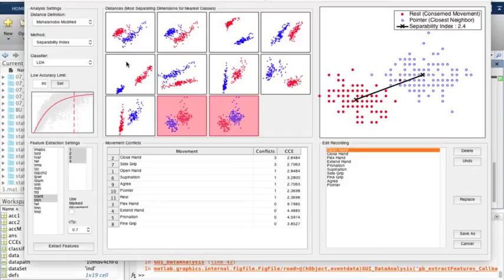The plots with white background are predicted to have good accuracy, while the ones with red backgrounds are predicted to have a lower one. The prediction is based on the input of this low accuracy limit that you set. So it's the accuracy that you're aiming at getting, and a correlation between classification accuracy and the outcome of the algorithm that has been observed through experiments.